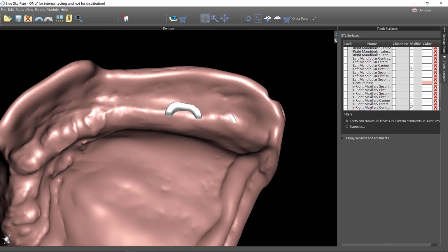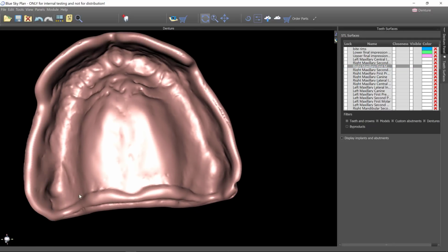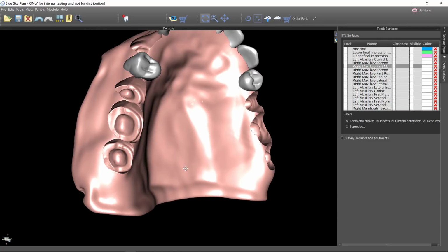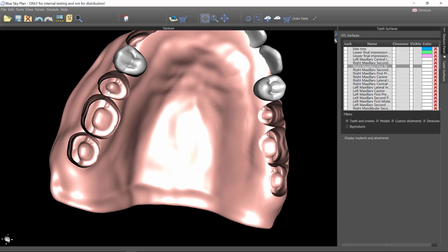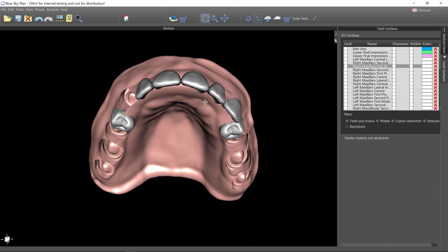Okay, this is the one, let's turn off those teeth. This is the one where the denture software knew that you didn't want any perforations into the interior, so it will adjust those denture teeth in the areas like you see right here. So it's critical that you be able to efficiently and quickly adjust the actual denture teeth so that they fit in here without having to guesstimate and hope that they're seated. So that's the way that gets accomplished.